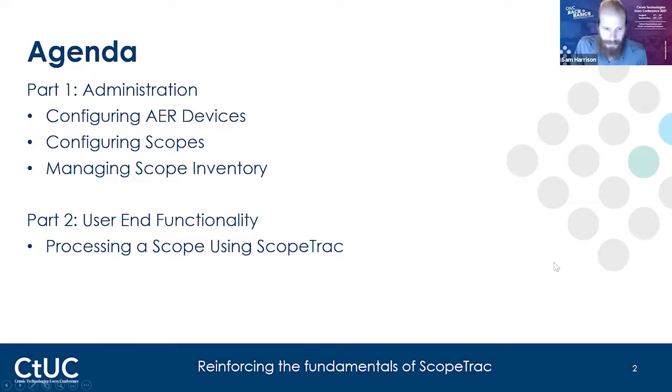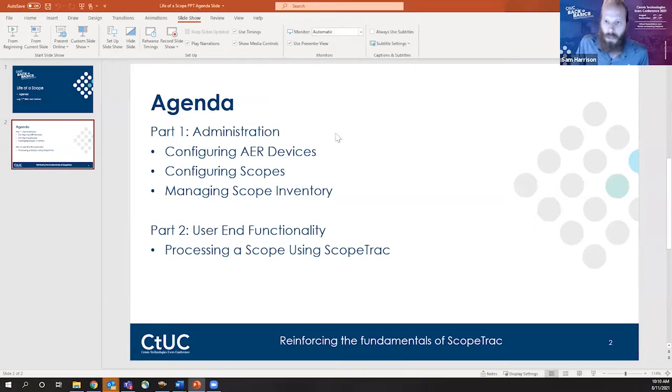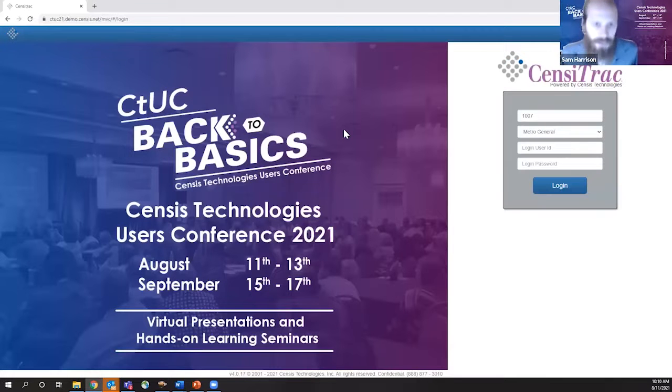With that said, I'm going to switch screens here, and let's go into the CensiTrac demo. All right, what you're seeing right now is our CensiTrac demo. This is what we're going to be working in for the next hour, and also for this afternoon's session, when you all come back, you'll be working in this demo too.